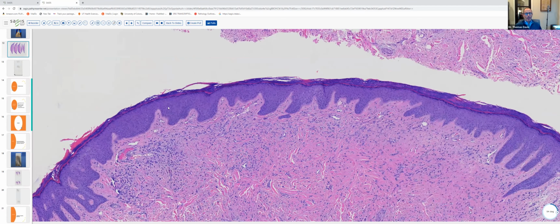And in this particular photomicrograph, let me zoom in, you can see that there was retention of P16 staining by the melanocytes comprising this proliferation. Here, many of the nuclei and some of the cytoplasm show decoration with P16, which is a favorable marker in Spitzoid-like lesions. And so the correct diagnosis in this case is an intradermal Spitz nevus.